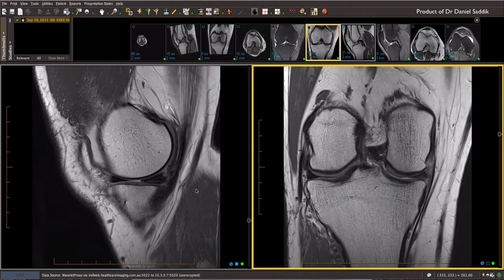It could be that the patient's had previous surgery. And so what would mark a previous surgery? Well, as I've said, a smaller meniscus. In this case, there is truncation of the meniscus. This patient could have a history. It could be due to previous surgery.